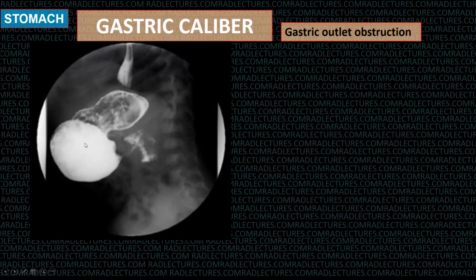The stomach may or may not be dilated much because these are kids. Their stomach is very active and it keeps on peristalsing even though there is obstruction. So this is a special type of gastric outlet obstruction.